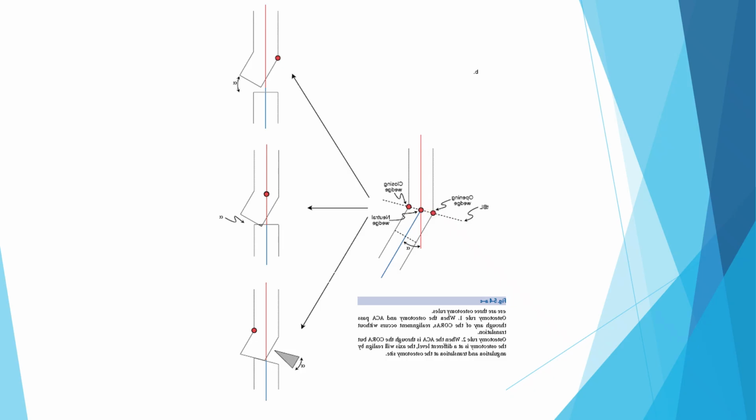What will happen is you will do translation with the angulation. So you will correct with translation and the angulation, which is here, because we picked this point. So it will give you this scenario in which you will end with a straight line and correction, and there will be some translation.